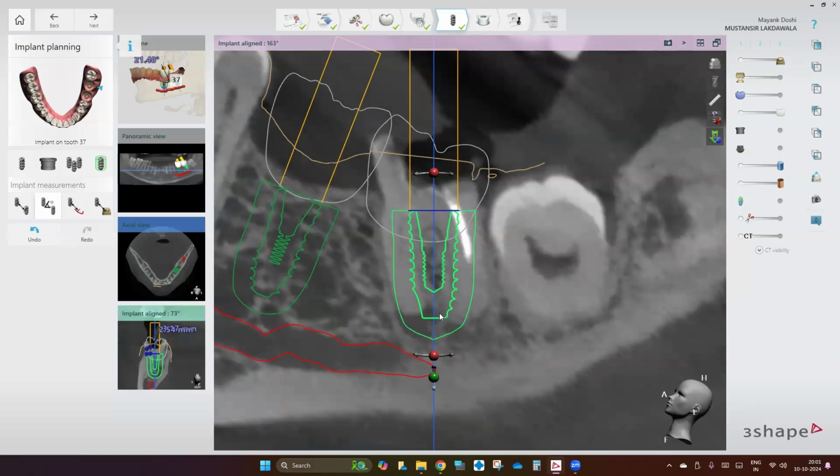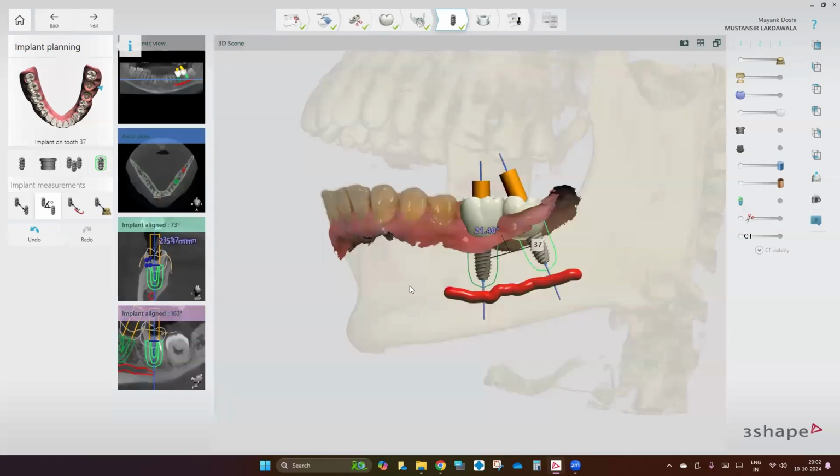Yes, in the furcation. Keep your mic on and respond a bit so that my speed increases. If you notice, are you still in the periapical area? Can you appreciate that? Yes, sir. You are still in the periapical area. Now let's go and see here. Can you appreciate the kind of angle this has formed now?